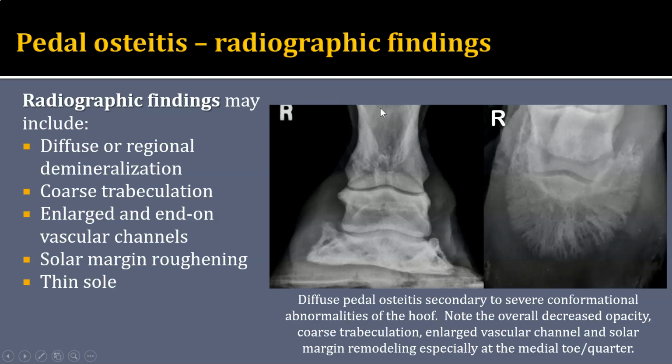wall as well. When we look at this patient in the regular dorsal palmar view, we can see that there is more thinning of the medial side of the sole and some imbalance that probably goes along with that hoof defect as part of this pedal osteitis.